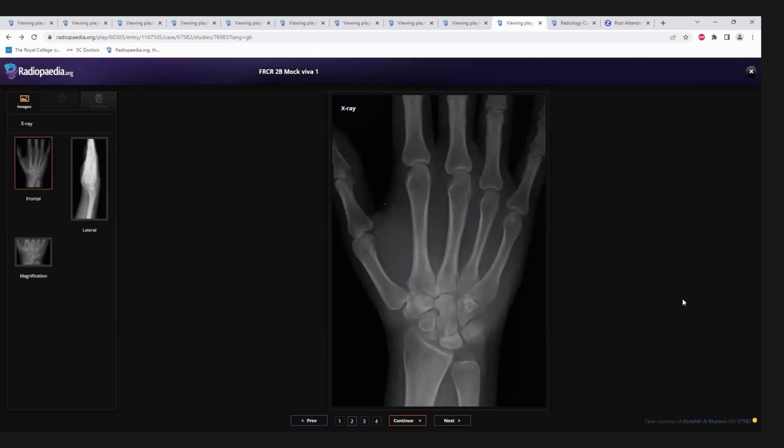You picked it up. Now, these are spotters, so I don't want you to miss anything. It's the first session, so I want you to get it right. That's the reason you don't have to revise it again. That was my whole aim.